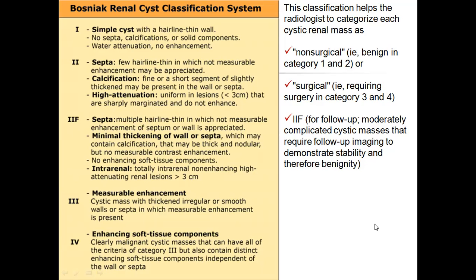I think there's no need for me to comment in great detail, to read all the signs of renal cysts of different stages.